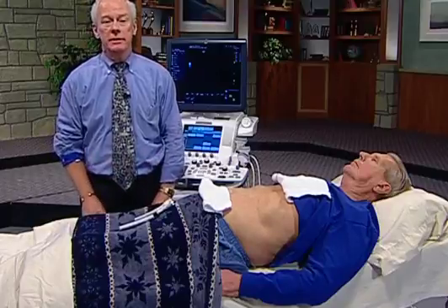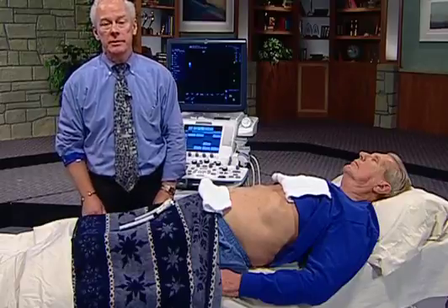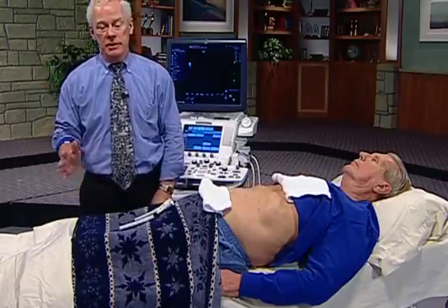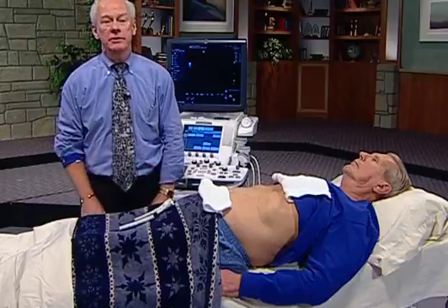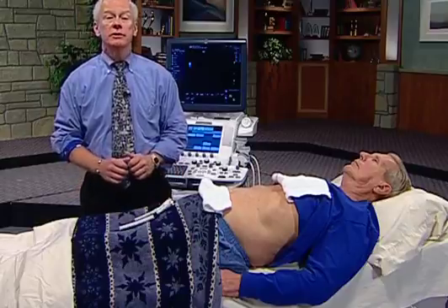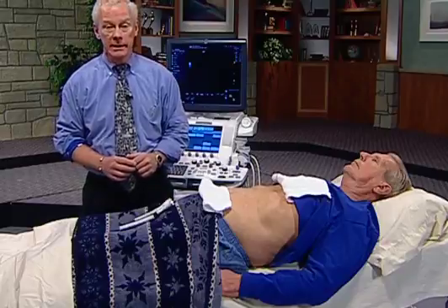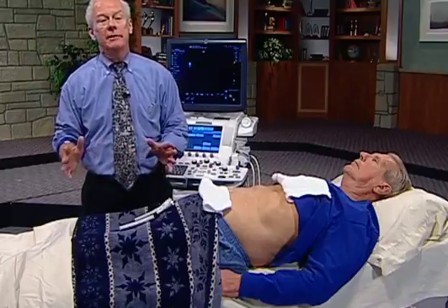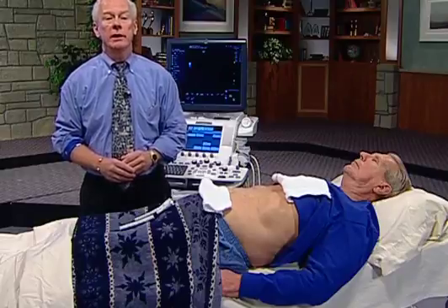By way of history, a patient with relatively long-standing high blood pressure, which has been treated medically, has a history of previous smoking, the ideal candidate and the person about which the SAVE Act was designed. An aortic aneurysm was discovered as part of a workup for a different medical problem. It was followed clinically. When it exceeded about 5 centimeters in size, the decision was to repair the aortic aneurysm.